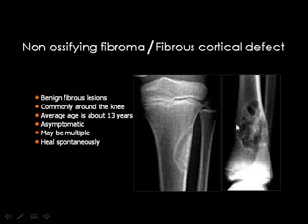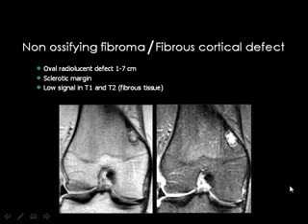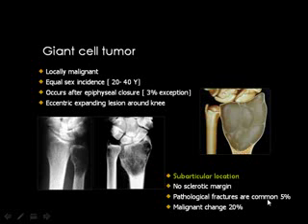But if there is expansion and the cortical bulge and the endosteal thinning, then you may suspect the non-ossifying fibroma. One of the golden advices is not to diagnose any fibrous lesion by MRI. There is a great incidence of error in the diagnosis using MRI for assessment of these particular issues. Then the plain X-ray is very simple, and you may reach the diagnosis very easily.